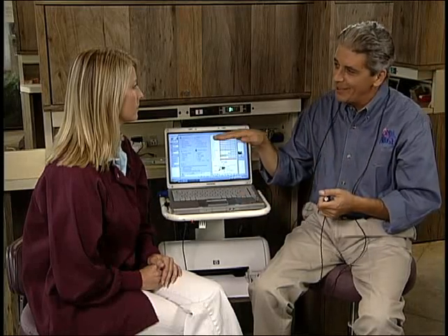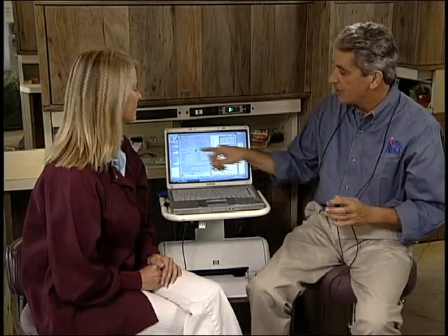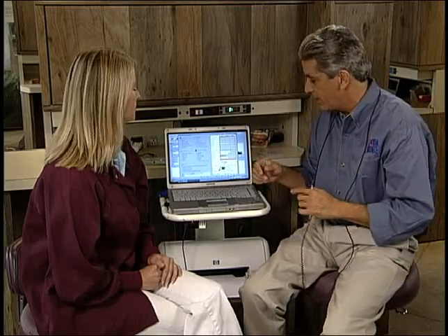For example, the average molar tooth length is 15 millimeters. If when we conduct the exam, we have the maximum pocket depth or clinical attachment loss of 7.5 millimeters, that's 50% of the tooth length. 50% of a 50-year-old patient is the median. If that were a 100-year-old patient, he's in great shape. If it's a 25-year-old patient, he's in very bad shape. So the age is a very important factor here.